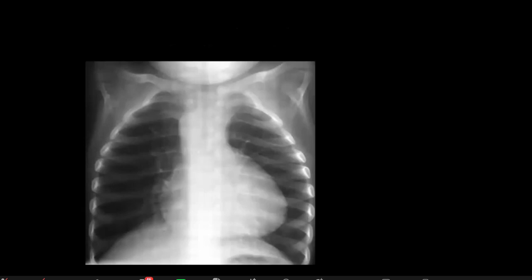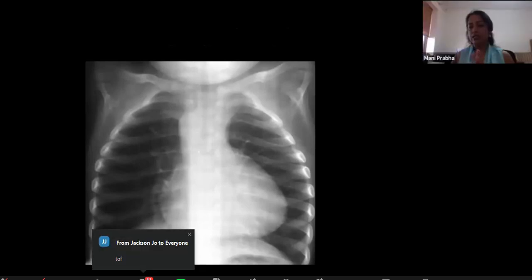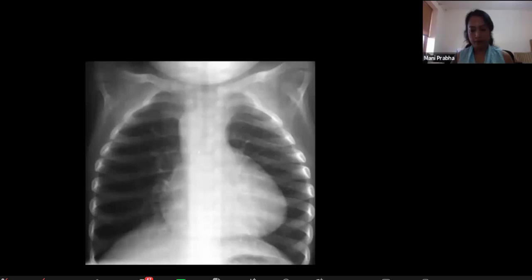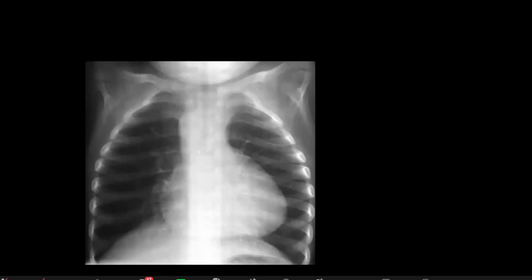Sure. So this is a chest radiograph of a pediatric patient. Since these are cardiac cases, if we do the sequential analysis, starting with the apex, that would be great. I'm starting to look at the cardiac silhouette. The apex is elevated, and the size and location of the aorta is central.